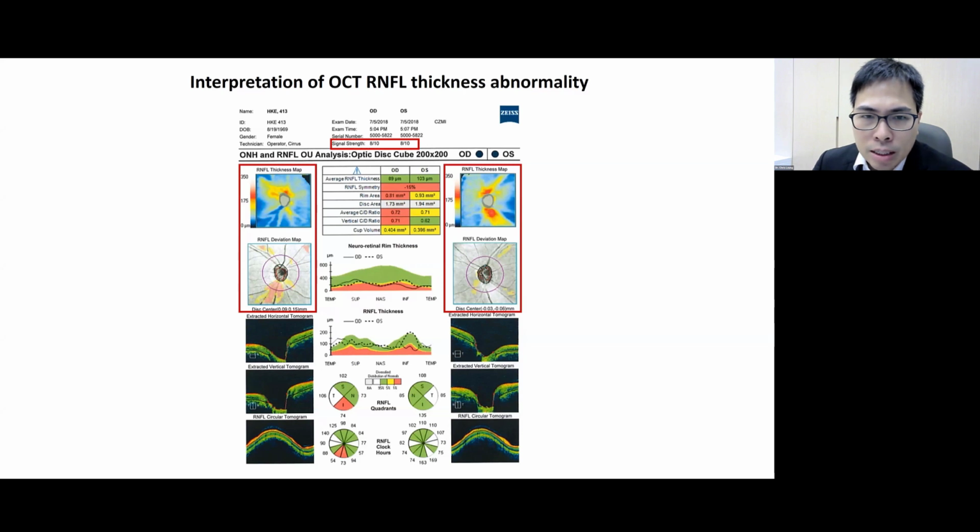So with OCT, this is what we typically obtain. I encourage you to look at the retinal nerve fiber layer thickness map. In the old days, not long ago actually, 10, 20 years ago, when we used OCT to image the retinal nerve fiber layer, we typically used a circle scan with a diameter of about 3.4 millimeter, just as what I show here with the arrow. So by convention, many OCT devices display this circumpapillary retinal nerve fiber thickness profile. And this is what we typically rely on.